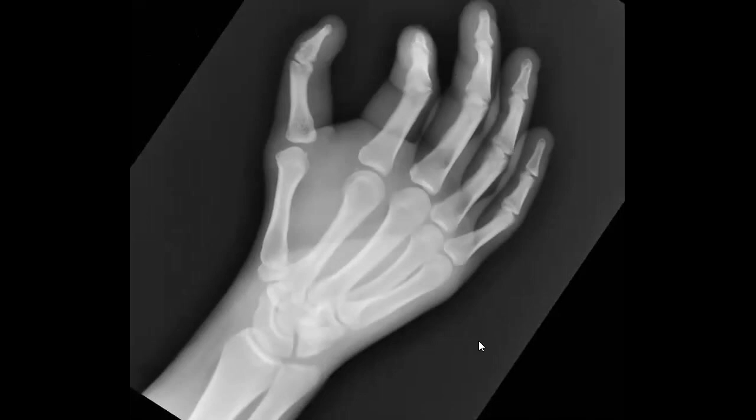They like in the rapid reporting to just mention the acute, like fracture, like inflammatory, something could be just like this. So mostly you are thinking about fracture or something acute. So what do you think? Where is the fracture? I will help you to think about the second.